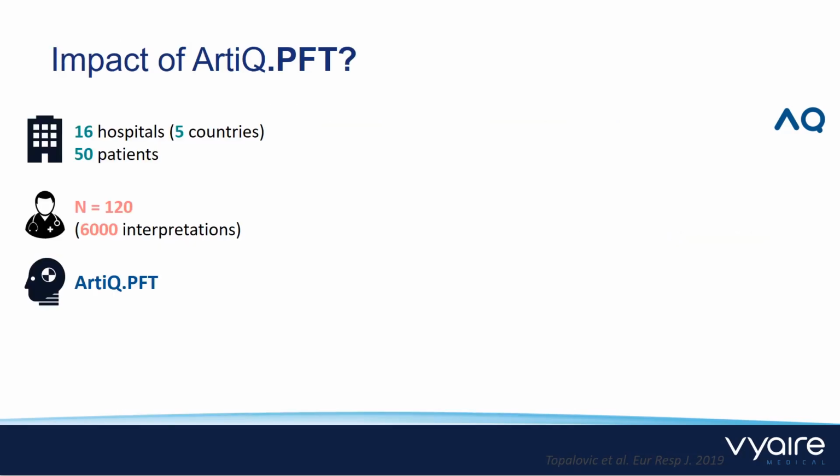To assess what impact ArtiQ PFT can have, the software has been used to provide the interpretations for the same cases from the study mentioned before. The software provided the interpretations fully automatic and almost immediately, and all protocols were in line with the international guidelines.